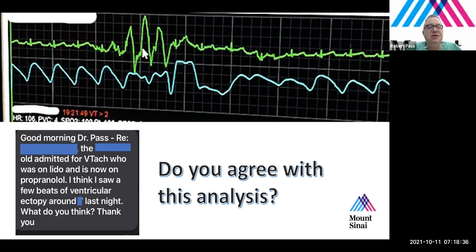So a good way to do that, the easiest way I think, is to set your calipers with a number of QRSs, because if you go 1-to-1, there may be very minimal cycle length variation, and you might get confused. So this is 1, 2, 3, 4 beats of QRSs. Then I took this same caliper and I went from there, and miraculously, the next QRS 4 beats later comes exactly on time, showing that there, in fact, are QRSs in here.